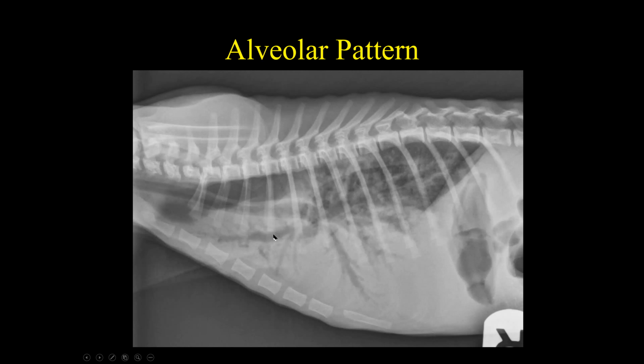And we know from our previous lecture that anatomy-wise, what structure lives just dorsal to that bronchus? Now, if you remember from our lecture, we know that the pulmonary artery lives right dorsal to the bronchus. And just ventral to the bronchus is going to be the pulmonary vein. So it goes artery, bronchus, vein on a lateral view from dorsal to ventral. So here's our bronchus, and we know the artery is sitting up in here.